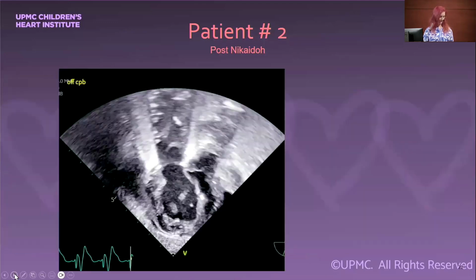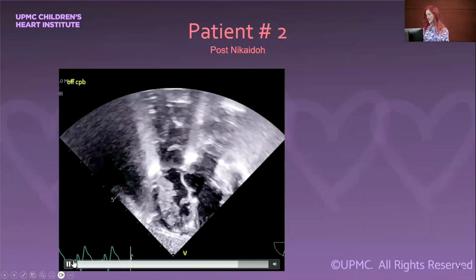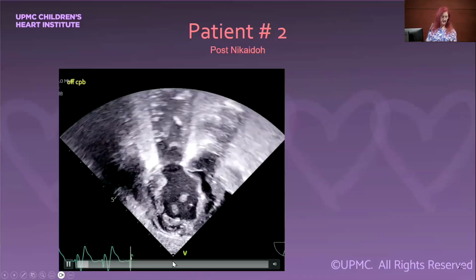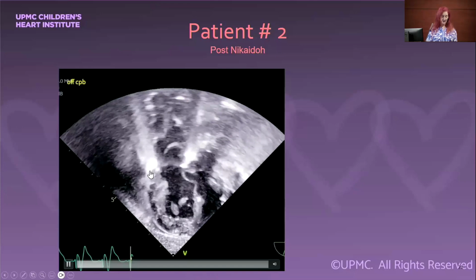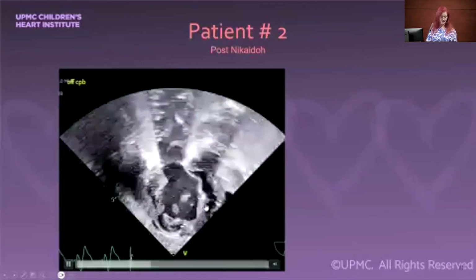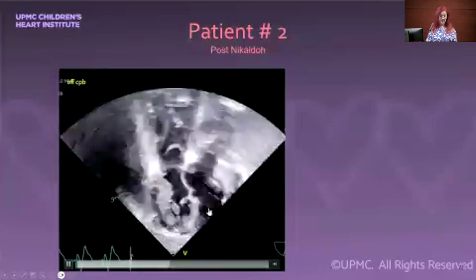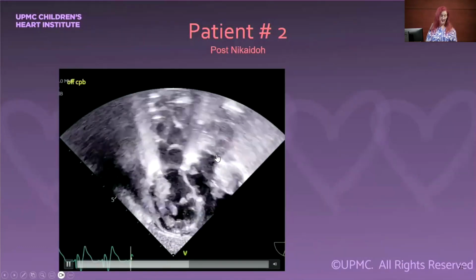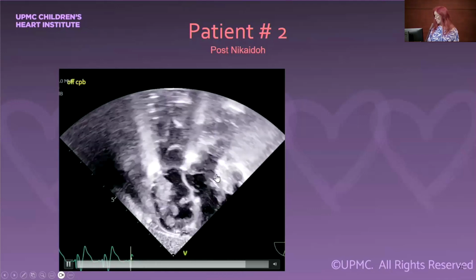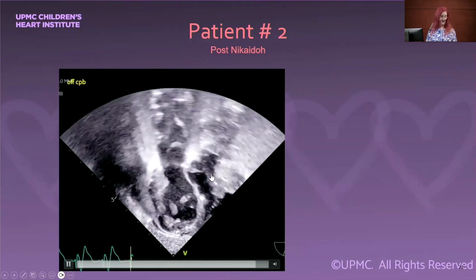Okay. Thank you. And then this is the last postoperative picture. So this is a transgastric view. So it looks a lot like a subcostal. So it's going to be head, feet, right, left. So here is your RV with the RV to PA conduit. Here is your septum. Here is your VSD patch. Here is your LV and aorta. And you can see that the LV to aortic tract is wide open, and it has more of a typical orientation. It doesn't have a bend to it.